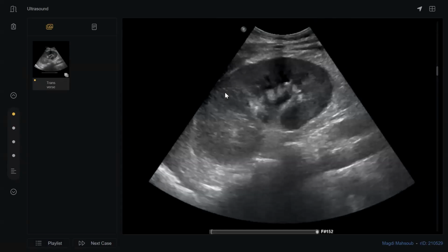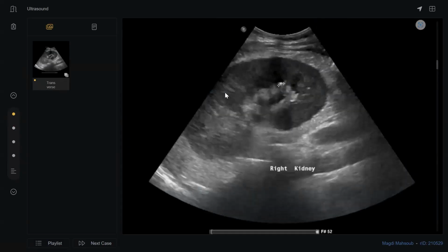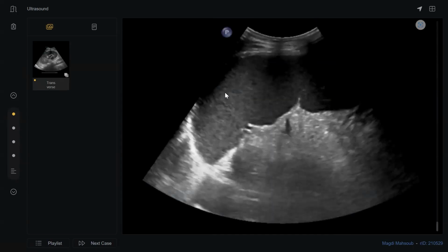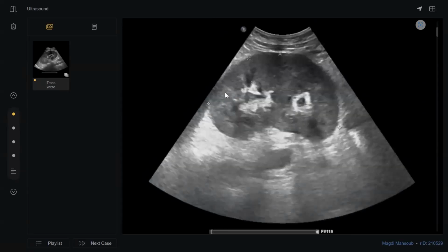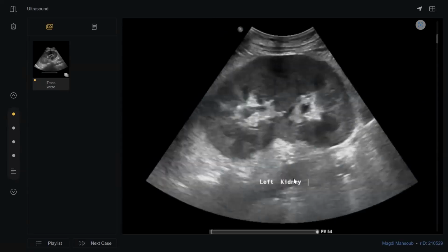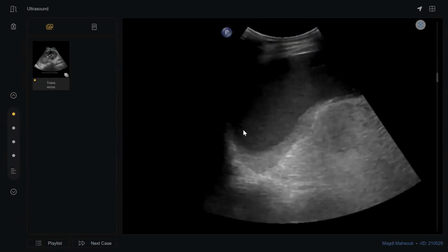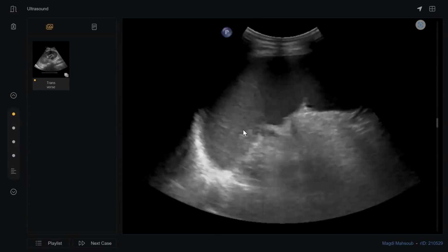You did very well. My colleagues, ultrasound and X-ray are limited studies. In our viva exam, what is required from you is to pick up a general idea. If you tell the examiner the kidneys look enlarged, that is very good, and there is minimal pelvicalyceal system dilatation or fullness.